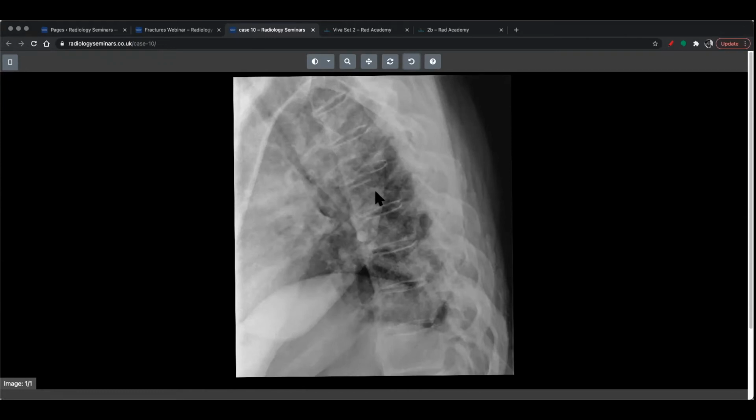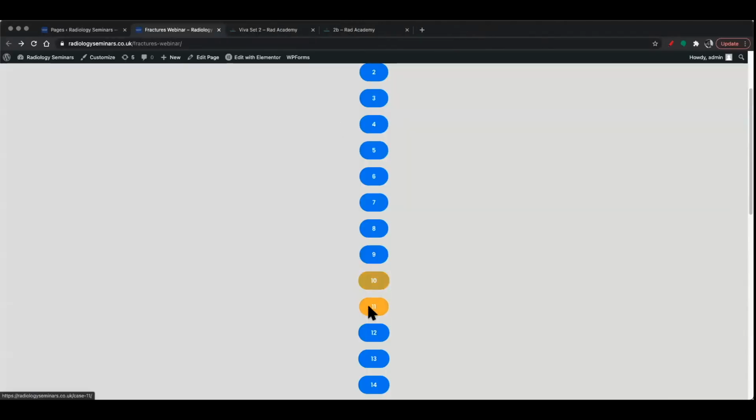Now, look, I've done a lot of trauma over the years. I actually worked at a trauma center. What usually happens is that when people fall, they'll fracture in the lower thoracic spine, not the upper thoracic spine. You'd be looking at T12-L1 because of the way people fold in on themselves. If you were to try and bend your body, you'd find yourself bending around T12-L1. That's usually when you get fractures. They're quite unusual, and people just glance and don't really look properly. That can be to the detriment of someone like this who actually does have a thoracic spine injury. Good, well done.